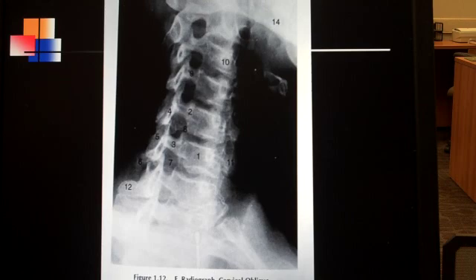And so my next question to you would be, why do we see two sides of the posterior arch not superimposing each other? It is because you do have tube tilt on this film. Now, if this was a left anterior, the tube tilt would be caudal, and if this was a right posterior, the tube tilt would be cephalad. Number 14 is just labeling the mandible itself. And I believe that's everything that has been labeled on this film.